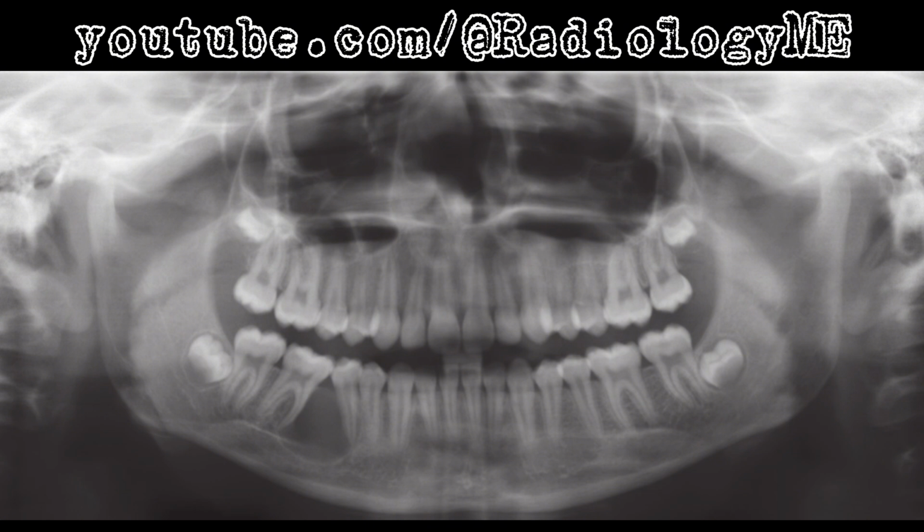The key points to mention would be the relatively benign nature of KCOT, the typical absence of root resorption, and its high recurrence rate if incompletely excised. In contrast, ameloblastomas tend to be more aggressive and can cause root resorption or cortical destruction.